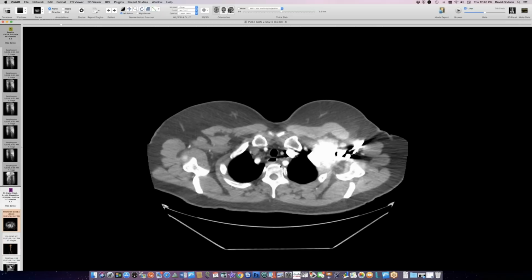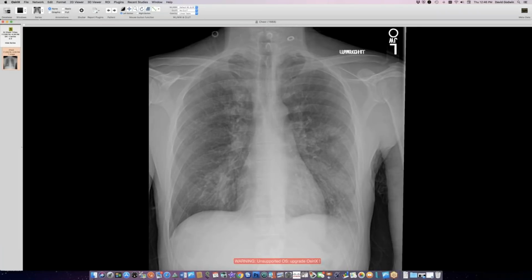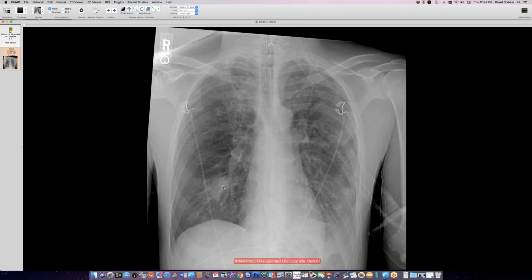You like it, okay. So here's a young guy who came in with a skin rash and ulcers in his mouth. So it was primarily a dermatologic presentation, but he's got this patchy low-grade lung consolidation. We just have 2 radiographs on him. Here's what he looked like the next day. So things were a little bit worse the next day, but low-grade patchy lung consolidation, lots of skin findings, and mucositis. And I don't know if you ever heard of MIRMS before, because that's what this guy has, M-I-R-M-S. Is that familiar to anyone? This was a new one for me.